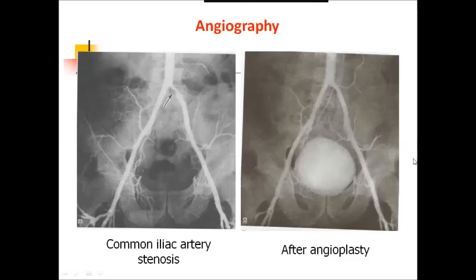For example, here critical stenosis of the left common iliac artery is shown on X-ray film, and after angioplasty, angiography confirms that blood flow in this region became normal.